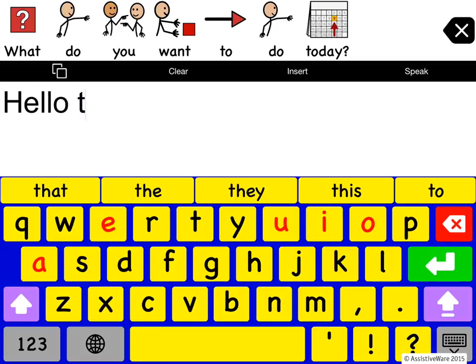Finally, if you're finding that a user is spending a lot of time in the typing view, and what we often see is that users use the grid and then every once in a while they switch to the typing view to type one of the words that they know how to spell but that they find a little harder to find in the grid.